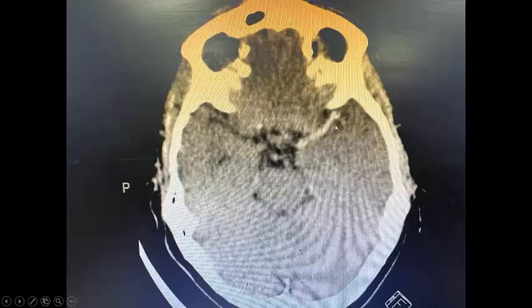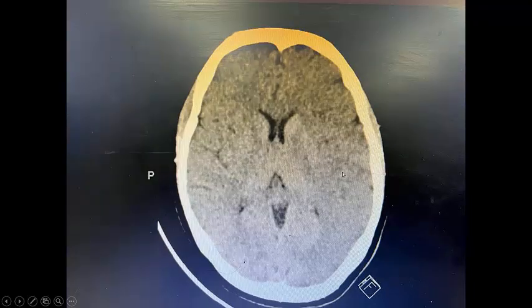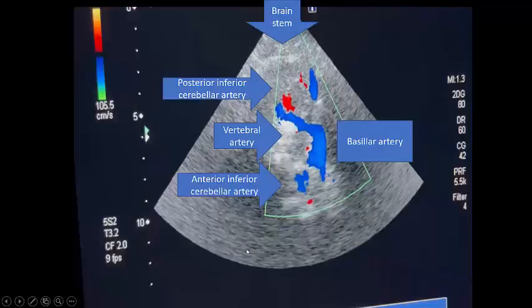In stabilization also we did CT with this a dense MCA sign with occlusion of the middle cerebral artery, and you see starting edema and hypodensity in the left side compared to the right side. You see here left side hypodense area compared to the right side. Here starts evolving left side hypodensity in all the left side really compared to the right side.